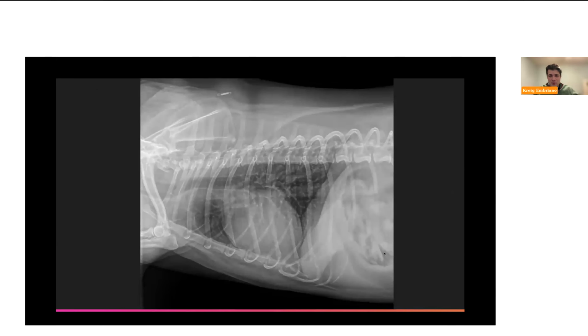And then moving on, I briefly mentioned rotated patients. And so, you want these ribs to be superimposed with one another. You don't want them to be so far apart from one another. All of this lung up here is superimposed with the ribs and the vertebral bodies and the soft tissues. This is not evaluable. I can't evaluate this lung at all. Also, want to make sure that those thoracic limbs are pulled cranially. So this is a study that I would say you should probably retake.